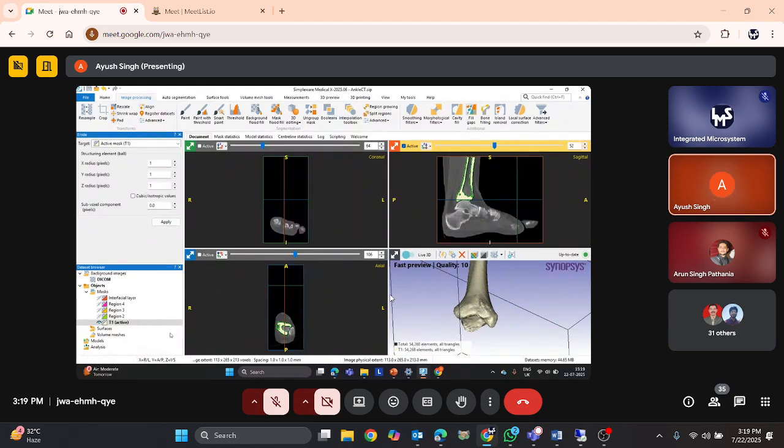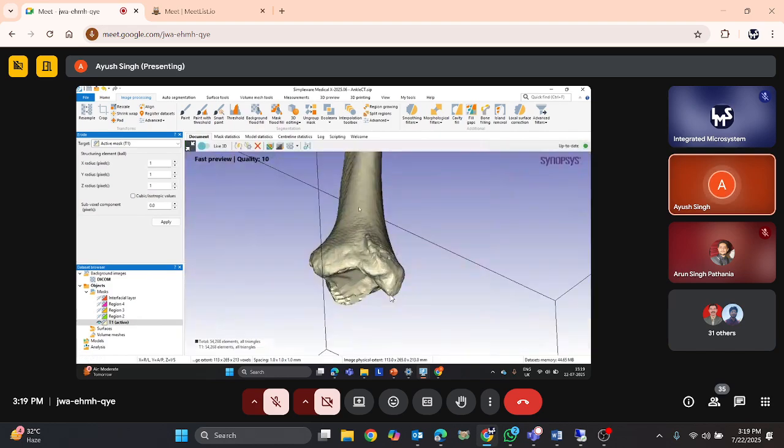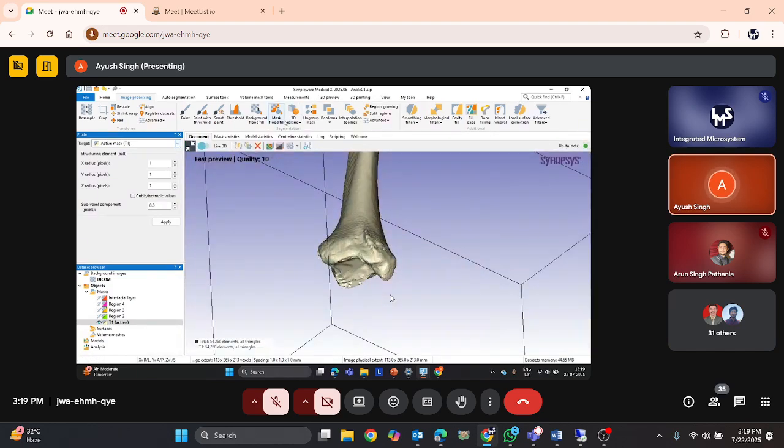We just copy a particular file from this mask using the dilate feature. Then we use certain Boolean operation to remove out the region. So this is how the 3D editing tool basically works. We can use any operation: smoothing, dilate, erode. Open basically moves pixels away by any pixel strength that we select between 1 to 5. Close brings the pixels together.